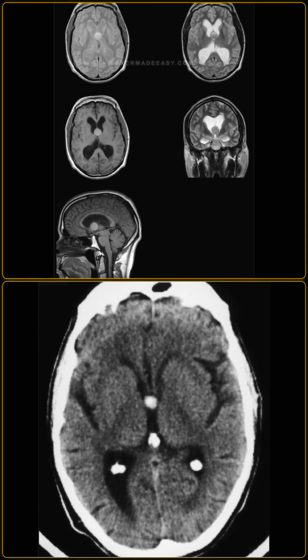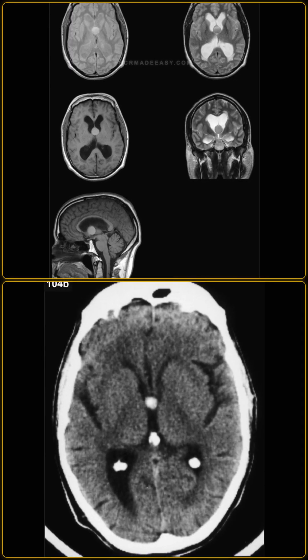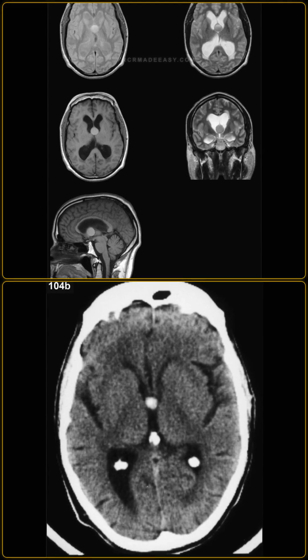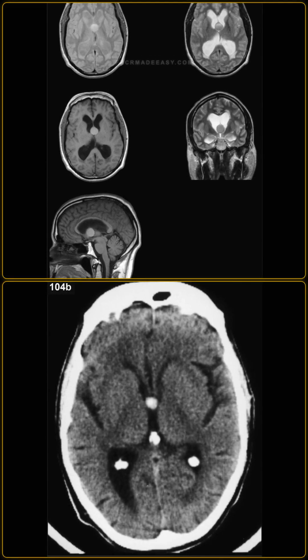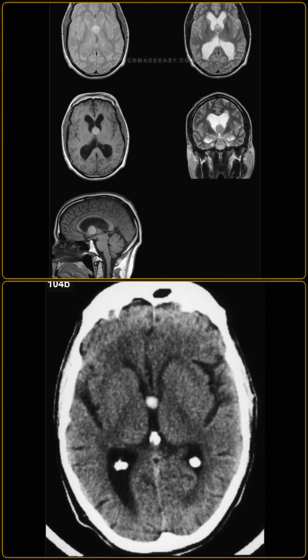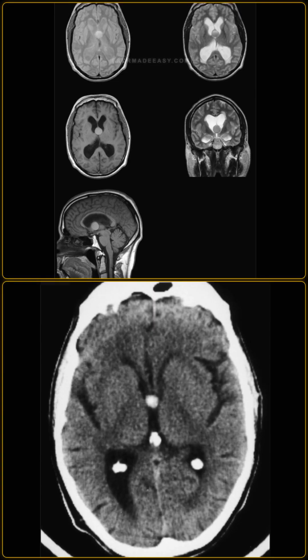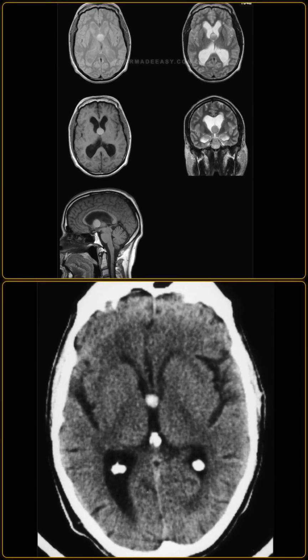As a radiologist, I would carefully assess for secondary signs of elevated intracranial pressure, such as temporal horn dilatation or tonsillar herniation. I would communicate this finding immediately as a critical alert to the referring physician. I would recommend an urgent neurosurgical consultation for cyst excision or endoscopic fenestration to prevent life-threatening CSF flow obstruction.